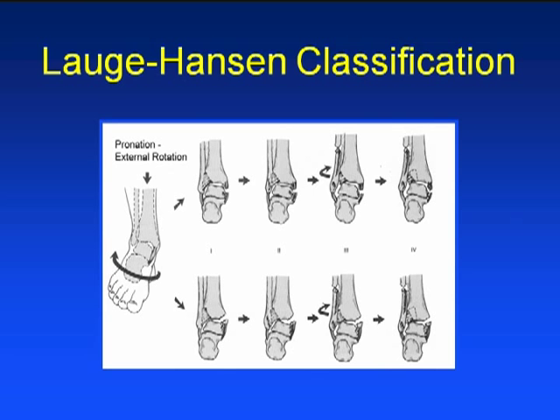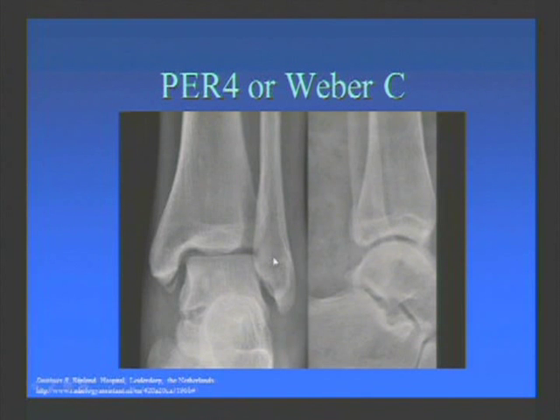So here you have a fracture, and at first blush, you look at this and you go, so you have an avulsive component here. There's clearly widening of the medial clear space, and we can discuss and or debate whether or not this is a widened tibio-fibular syndesmotic clear space. I don't have a good rule of thumb for that. I know that after you look at a bunch of them, and we've probably all looked at a bunch of them, sometimes they are hard to detect, sometimes they are fairly easy to detect.